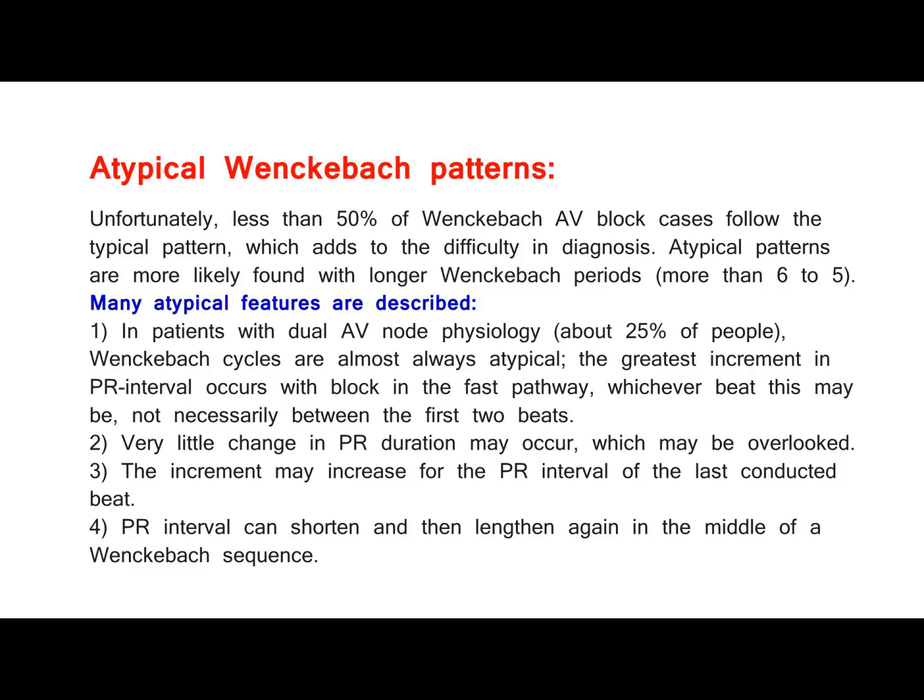Atypical Wenckebach patterns. Unfortunately, less than 50% of Wenckebach AV block cases follow the typical pattern, which adds to the difficulty in diagnosis. Atypical patterns are more likely found with longer Wenckebach periods, more than 6 to 5. Many atypical features are described.